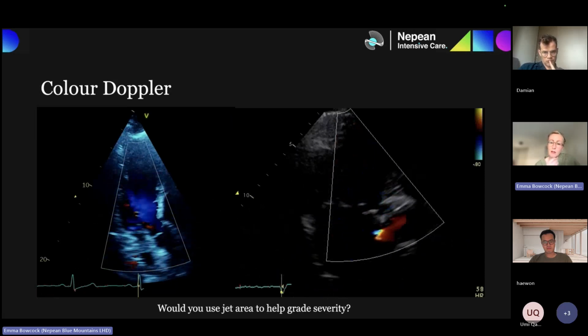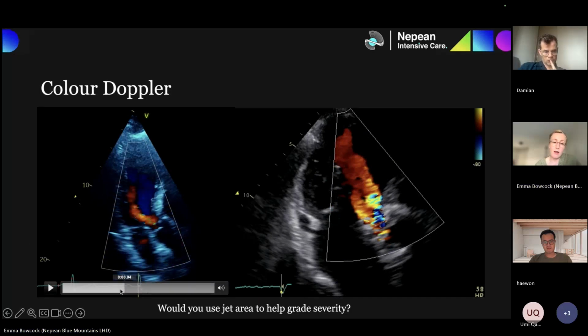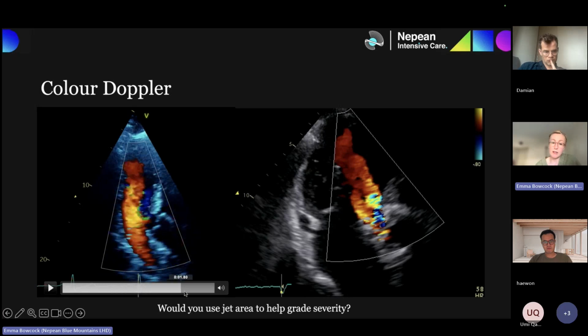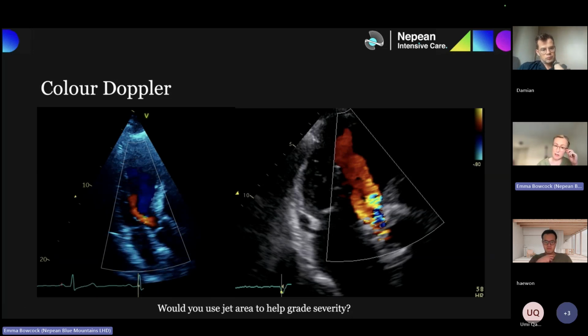In the 3-chamber color, showing mild aortic regurg, or what would be typical of a mild to moderate aortic regurg. I don't know what the rest of the values ended up being, but we're not seeing much of a flow convergence, just slowing it down in diastole there so you can see it. And it's not really the right angle to measure a vena contracta on, is it? Because you want to be ideally perpendicular to the jet to do a good vena contracta.